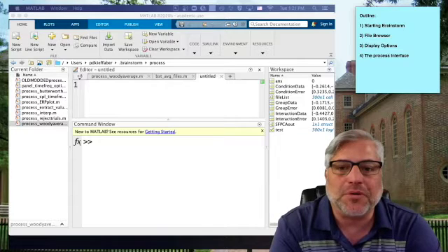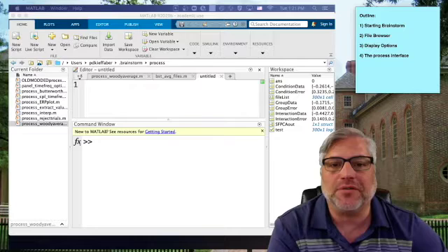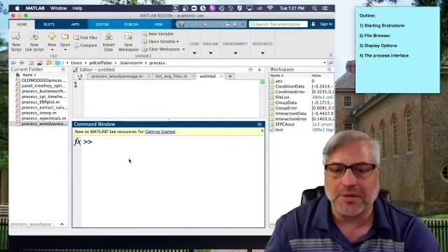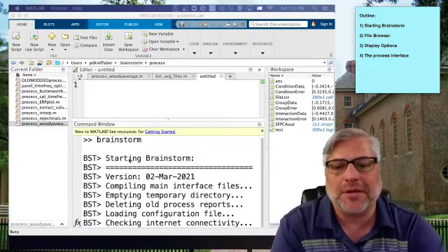In this video, I'll be reviewing just an introduction to the Brainstorm graphic user interface. You'll see that I've already started MATLAB here, and the way to get Brainstorm started is simply to type Brainstorm into the MATLAB command line.